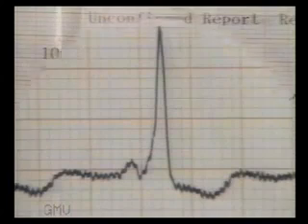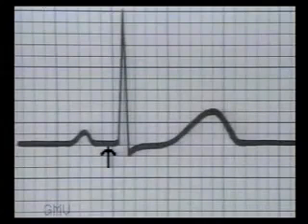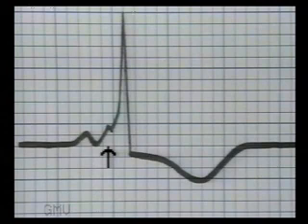It is important to know the presence of WPW syndrome as it often leads to serious tachyarrhythmias in later life. The isoelectric line between P wave and QRS complex is due to the AV nodal delay. But in WPW syndrome, the impulse leaks to the ventricles via an accessory bundle of fibers called bundle of Kent. So the isoelectric line between P wave and QRS complex is replaced by a slurred upstroke.